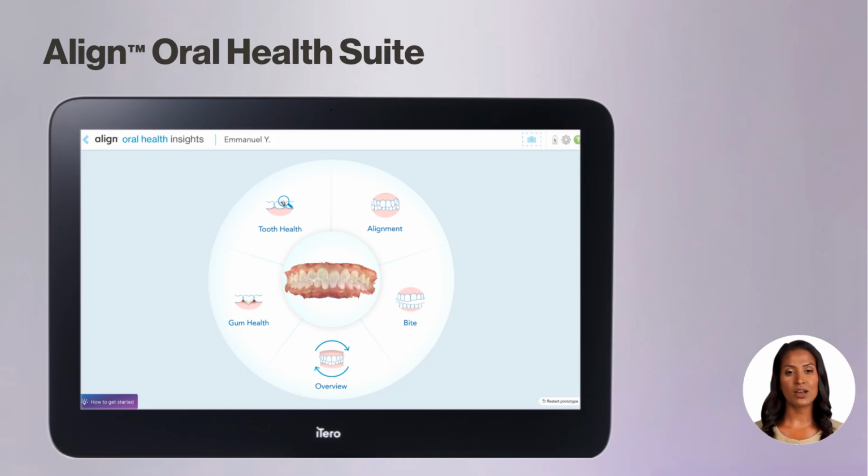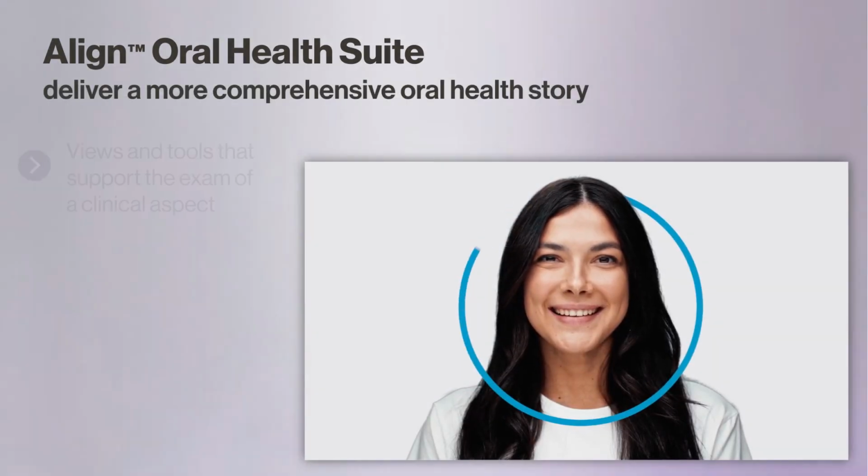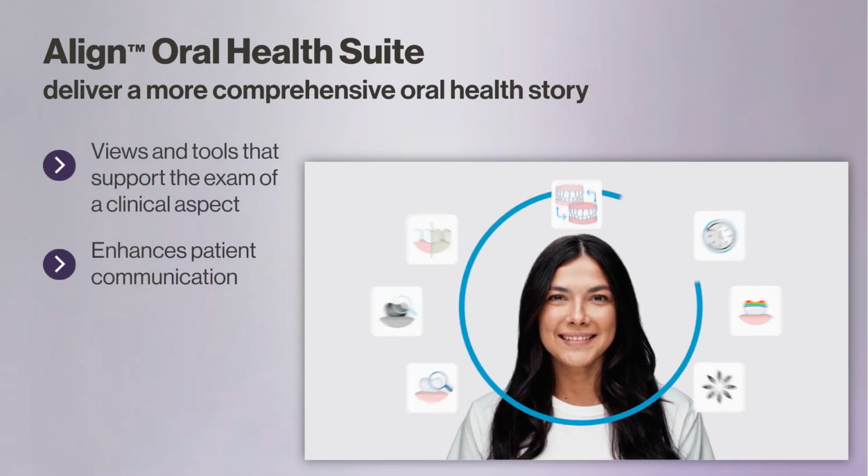The Align Oral Health Suite provides a comprehensive view of a patient's oral health. It supports the diagnosis process and allows practices to elevate the way they conduct exams. The patient-friendly interface enhances patient communication by presenting a comprehensive oral health story. Each tab of the suite and associated tools supports the exam of a clinical aspect, enhancing patient communication.